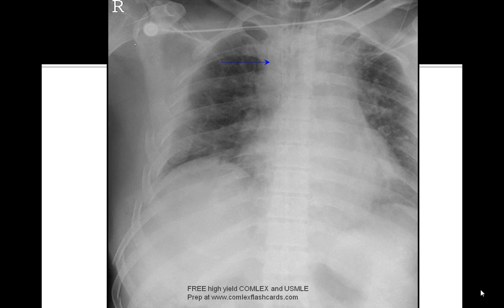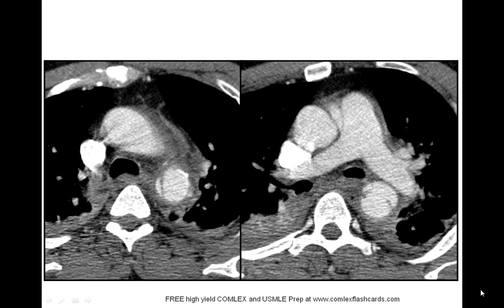So what do we mean? Well, as a medical student and resident, you should be able to find the following findings on the chest x-ray. You can see here that there is an opaque paratracheal stripe. There is rightward deviation of the trachea, and decreased definition of the aortic arch is clearly seen. Again, another view here is going to show you an interesting finding of pseudoaneurysm. So keep all these factors in mind as you are thinking of a case with an aortic injury.